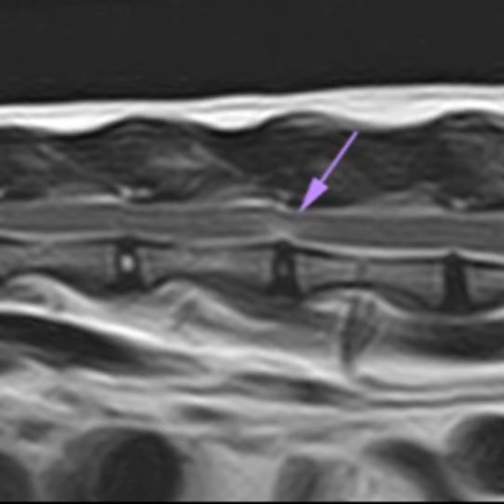That's especially in older cats. I remember vividly a cat having two discs in the lumbar spine, having hyperintensity in two different areas, but he was an 11-year-old cat, so the discs were degenerated. Yeah. Let's see if there's any.